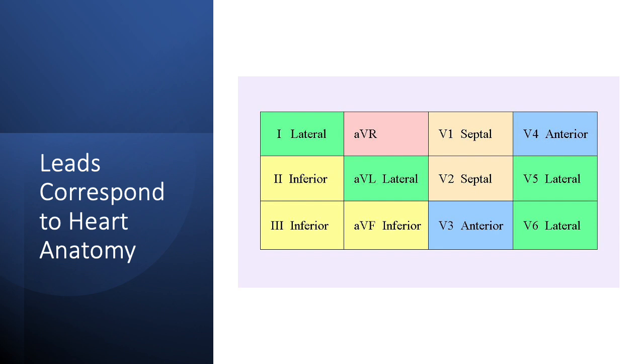This becomes important because there may be some older ECGs that you'll see as an example where the leads are not labeled. And so it's important to know where to find each one of these leads on a 12-lead ECG.